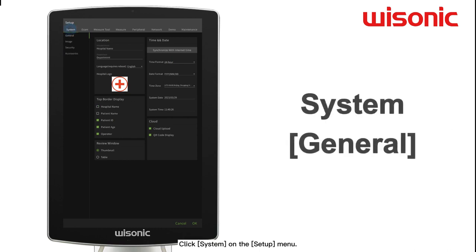Click System on the Setup menu. Enter General. The location, time and date, patient information, and review window can be set up. You can select the items to be displayed in the main interface.